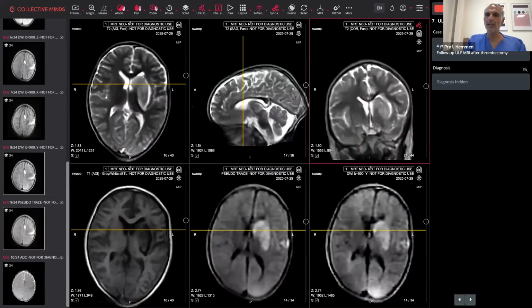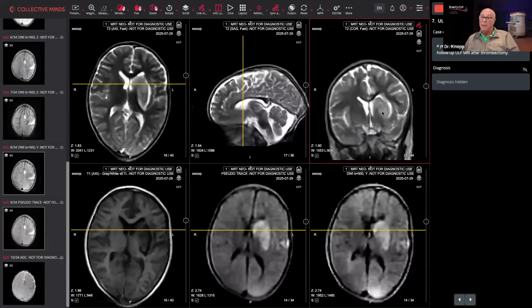Okay, thanks. And of course, then if I could rescan after 6 hours, 10 hours, 12, 24, whatever, this is of course something that we would carefully look for if there's any signs of edema. Right. Clearly, there could be more edema mass effect related to this, in which case you would expect some midline shift so that the septum pellucidum here would be more over towards the right, indicative of increased mass effect, so you'd have to deal with that accordingly.